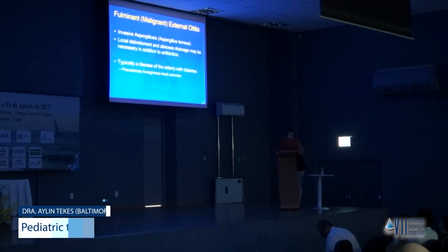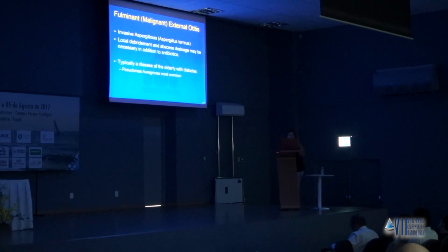This patient got drainage and grew invasive aspergillosis, which is typically seen in elderly patients, usually with diabetes, and Pseudomonas aeruginosa is typically the most common one. And in this one, it turned out to be Aspergillus terreus. So this is a patient with fulminant external otitis.